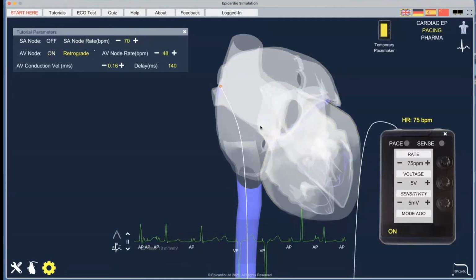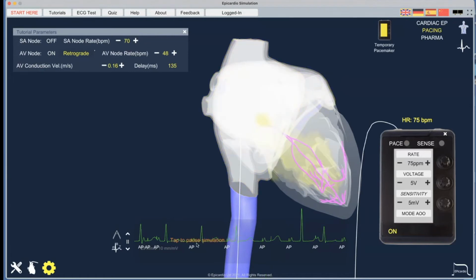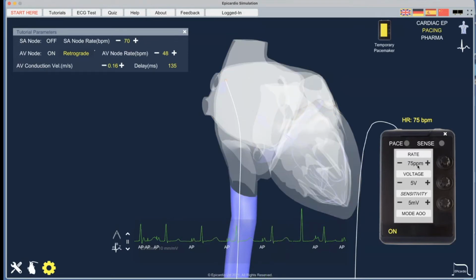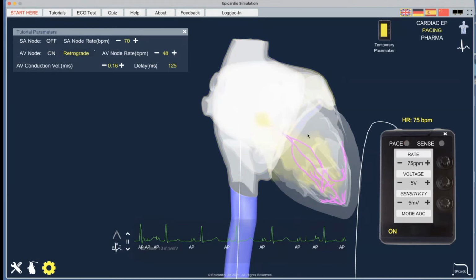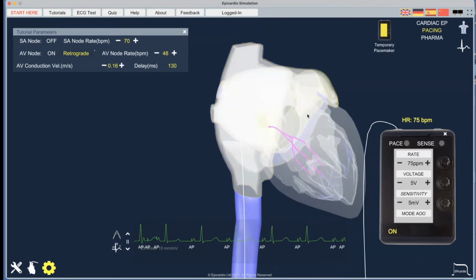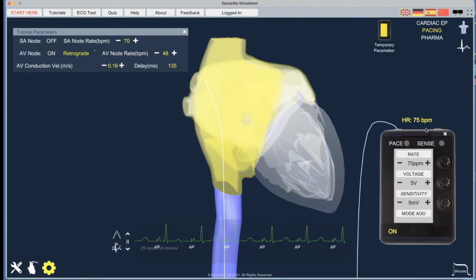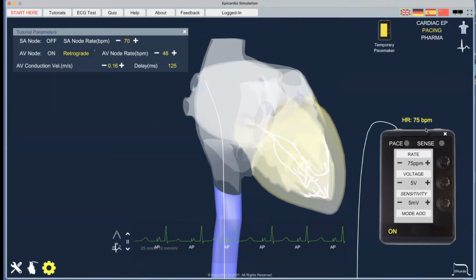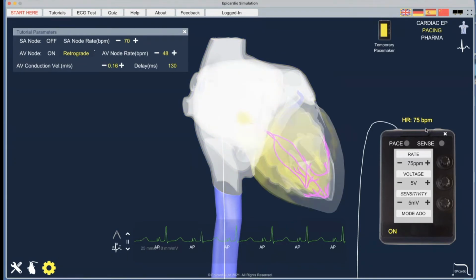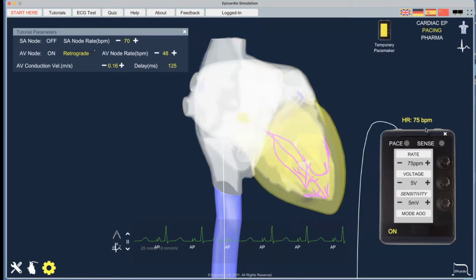Well, the AV node is switched on, so we can allow passage of the electrophysiology from the atria into the ventricles. So what I've done is, using the pacer, I've almost recreated a normal rhythm, because I'm pacing at 75 beats per minute from the SA node. So my pacing device acts as the SA node. So this set of tools, the EP parameters and the temporary pacing, is a very good set of tools that will allow you to completely control the heart and create scenarios and test different hypotheses, and also play with the heart if you like.